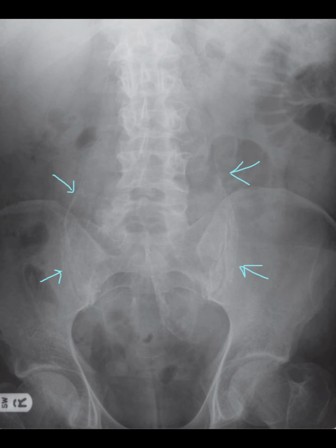For example, vascular calcifications can suggest aneurysms, such as abdominal aortic aneurysm or splenic artery aneurysm. Other possible calcifications include adrenal and vesical calculi, which could be due to previous infections, infarctions, or malignancies. In women, uterine calcifications might be seen, commonly related to fibroids, while adnexal calcifications could indicate dermoid tumors.